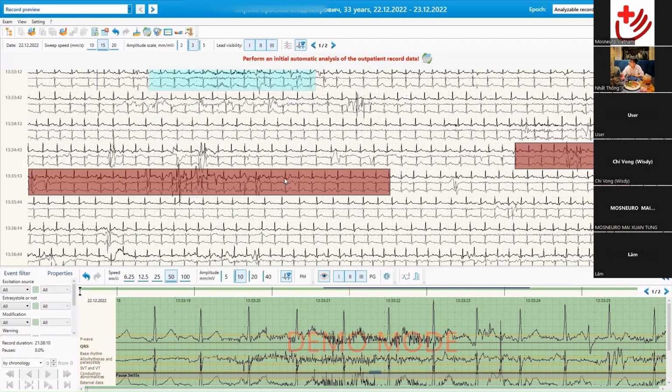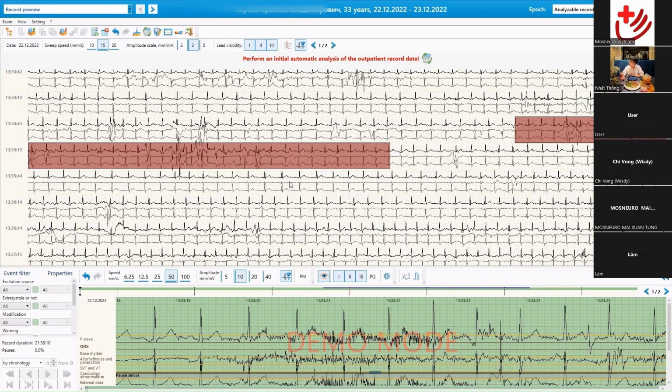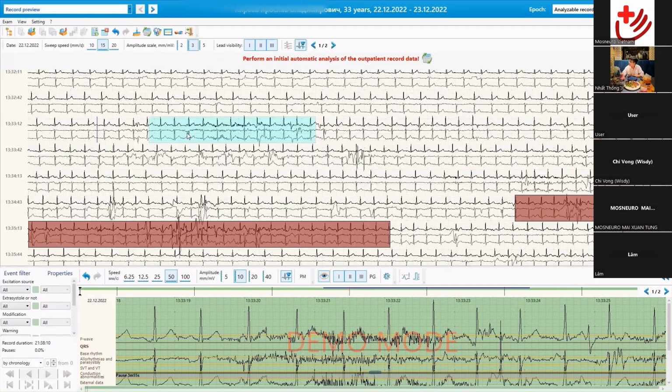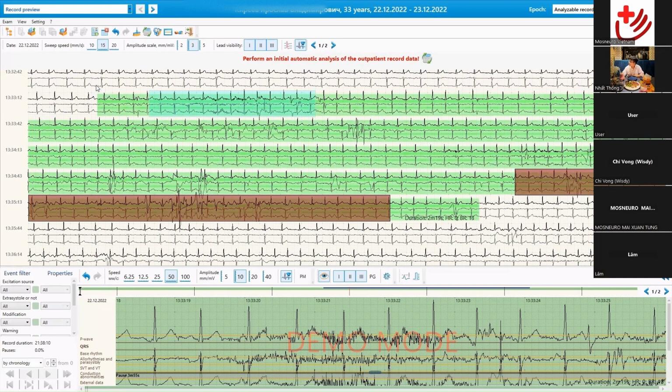And then you can scroll all the way through the record, as long as you want, but I don't want to be too long. The main idea is that this first marking may be far away on another screen, and then you just press the Shift button and left mouse again, and all the record between these 2 points is now selected. So it's quite easy.